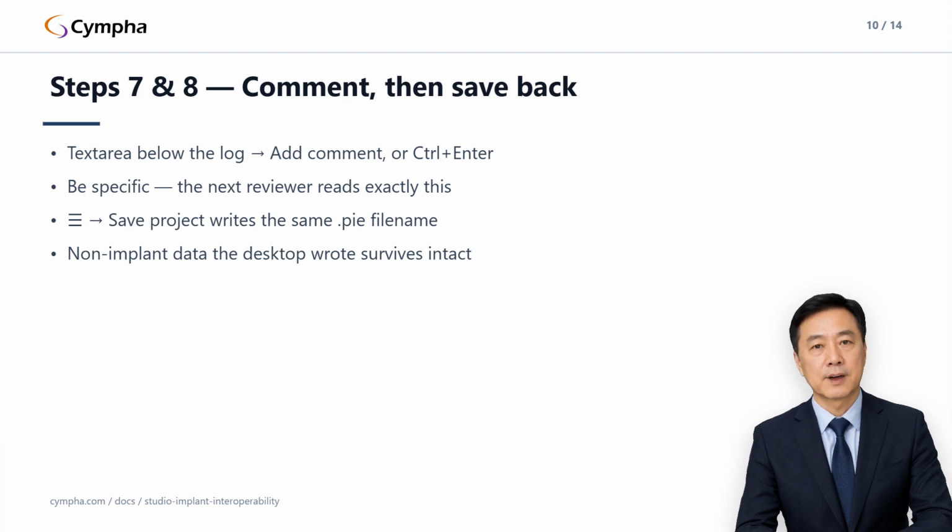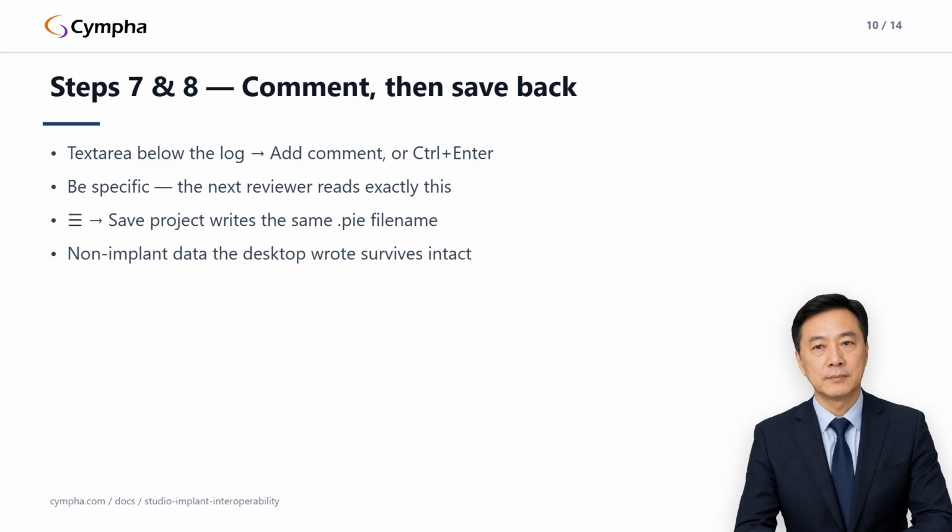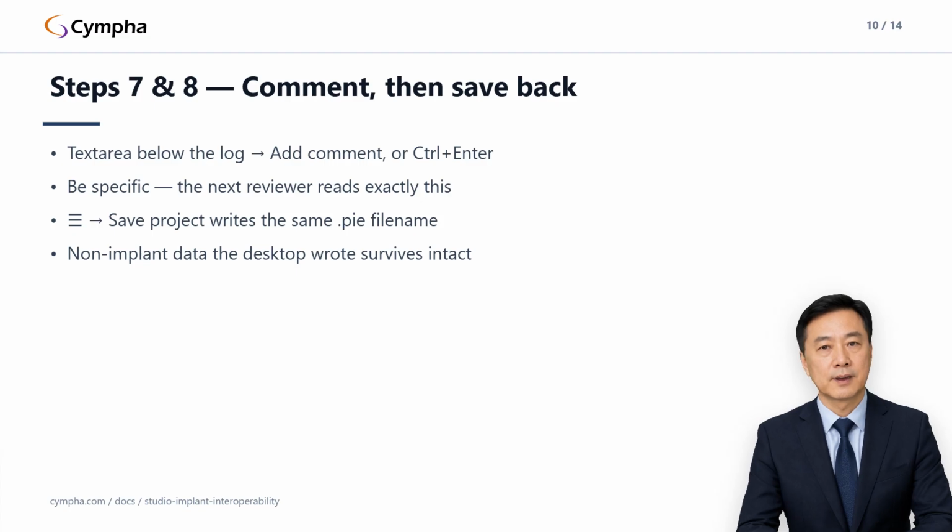Reach for it when you don't have a project file yet but want to share an implant plan with someone on a different desktop application, or when you're importing positions from another tool that exports this format. Inside the implant toolbox, Export Plan writes all current implants to a downloadable file, and Import Plan loads placements from one, adds the sleeves, and deliberately skips any teeth that already have an implant, so you can't double place by accident. But be clear, the two formats are not interchangeable.